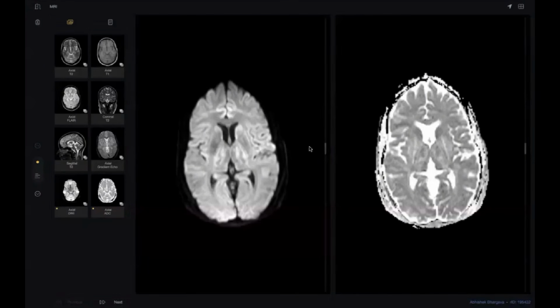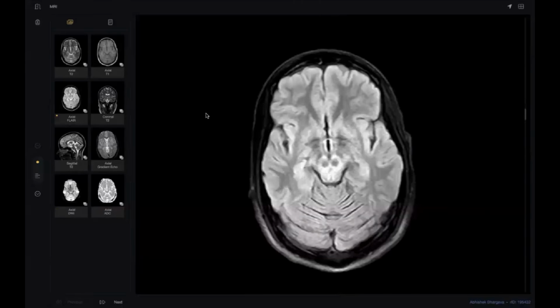What else? Look at this slice. Maybe the answer is in this slice. What do you think? As regards the affection of the midbrain also, I'm not sure. Maybe some toxin poisoning or carbon monoxide poisoning. What is the name of the sign?